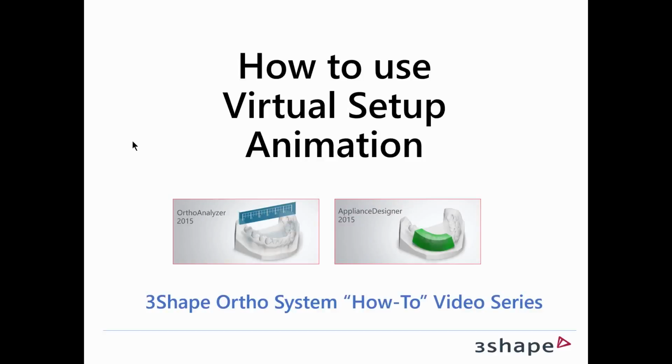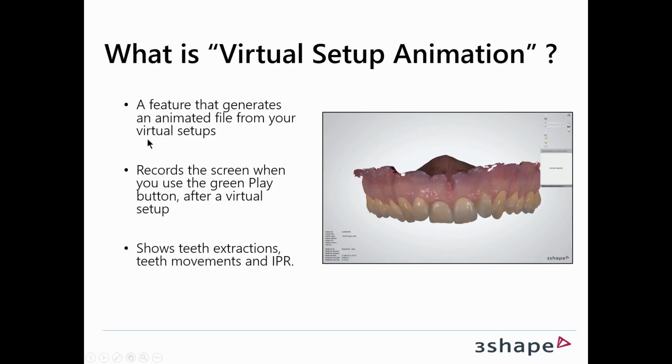Welcome to the How to Use Virtual Setup Animation training video. So what is Virtual Setup Animation?